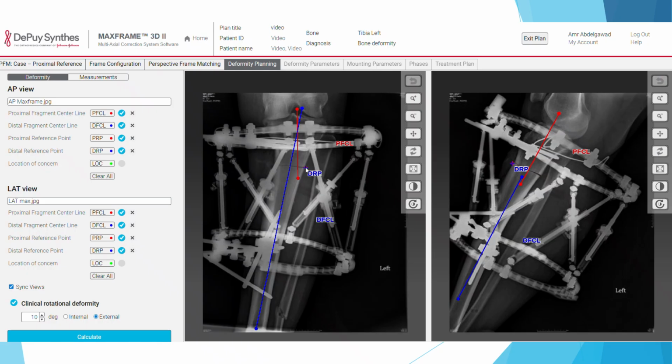Let's say that you decided to put the dot here. Okay, let's go to distal here, and we have the sync here, so we can move it easier and faster. We'll move the distal here, and keep the distal here. We're not doing any correction in this plane, so it does not really make a difference. You can put this here and put this here.